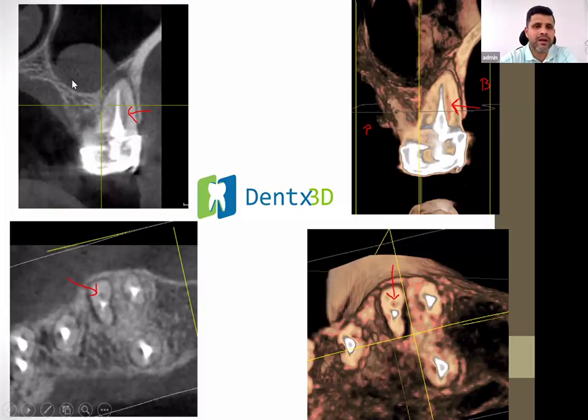Like I said, the gray part is always the tissue. So the soft tissue growth in the sinus is dome shaped. So it is benign mucosal thickening of the maxillary sinus.